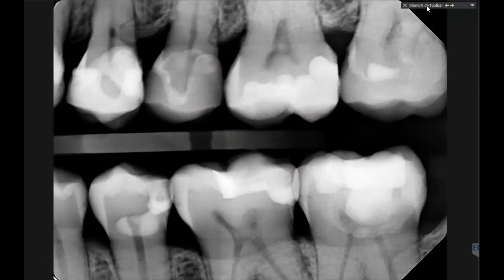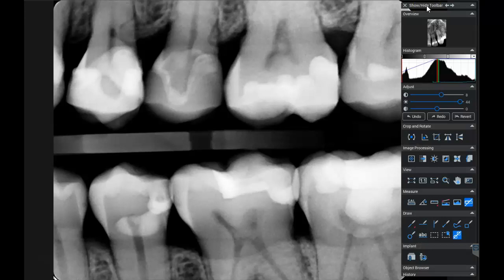But if I maximize the toolbar, quite interestingly, the thumbnail that is viewed is not the thumbnail that is in the large screen, which of course means that if I try to darken or lighten the image that is enlarged on the screen, the one that's in the thumbnail is the one that is actually getting edited and changed.